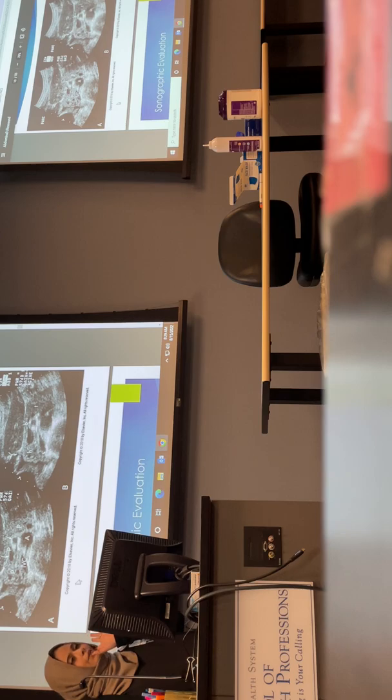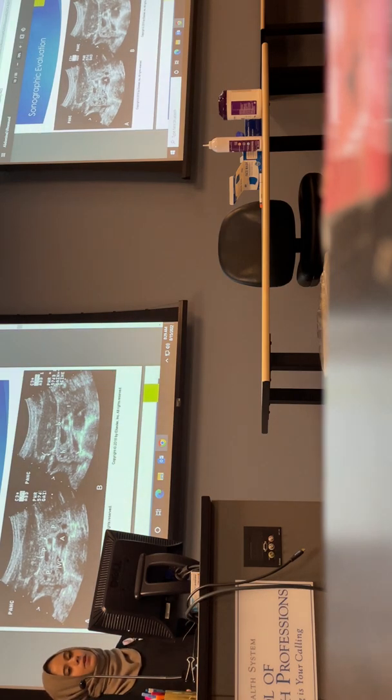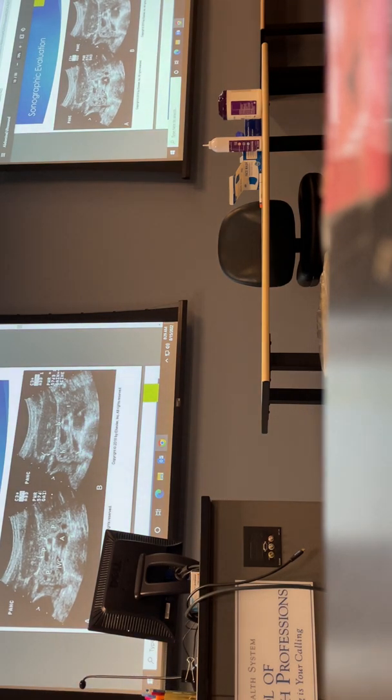Okay, starting off, firstly, what view are both of these images in? Are they in a transverse view or a sagittal view? Transverse, right? You can clearly see we are in a transverse view because look at the aorta, the IVC, the SMA. Those are your landmarks. You can clearly see that those are in a cross-sectional view. They are rounded. That proves that this is a transverse view. If the aorta and the IVC are elongated, that means that we are in a sagittal view. So this is a transverse view and a transverse view.